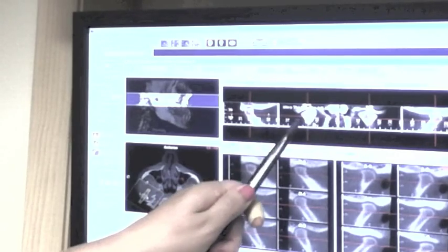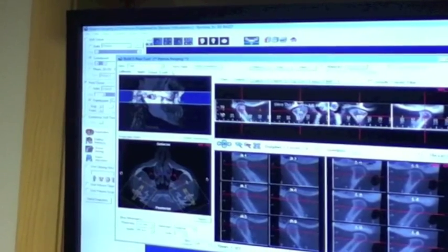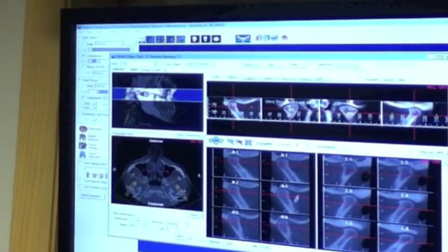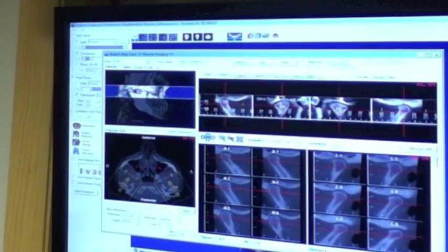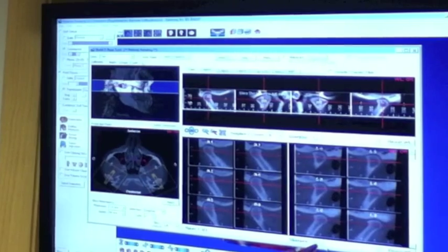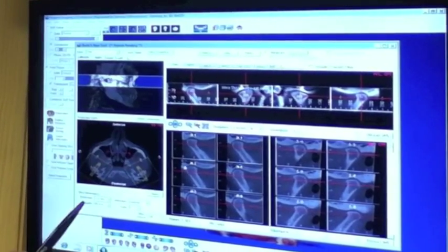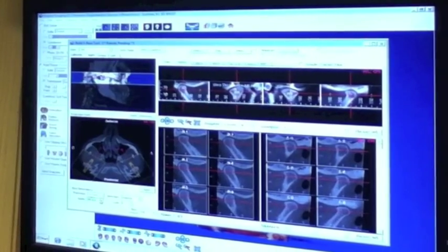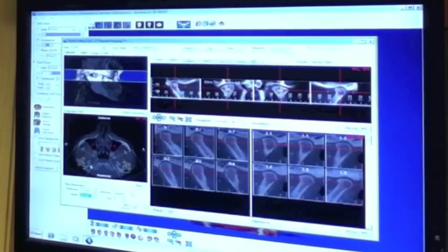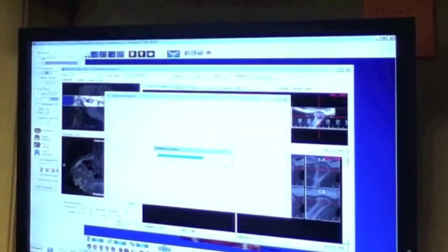You can move these yellow marks in the condyle so you get a clear picture of the condyles below. You can also sharpen the image and change the width to your doctor's preference. And then send snapshot, save to Dolphin layout.